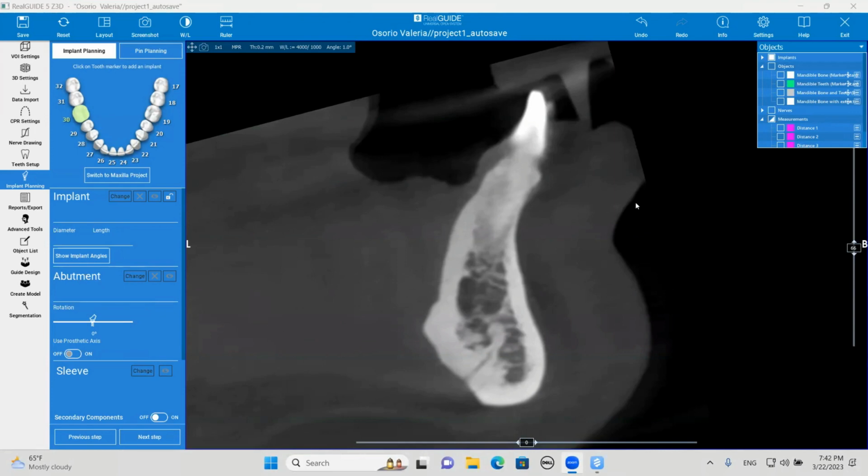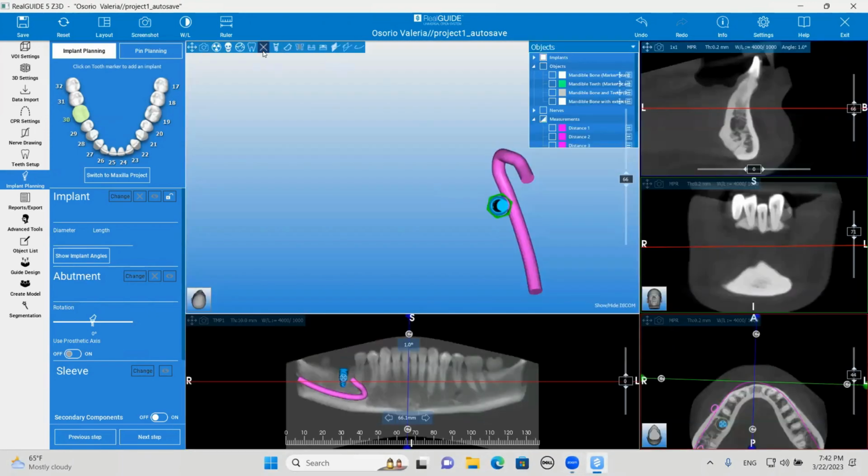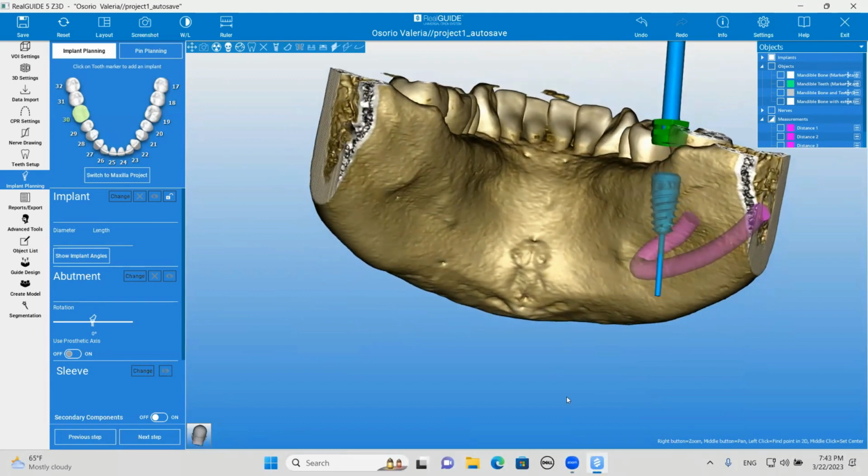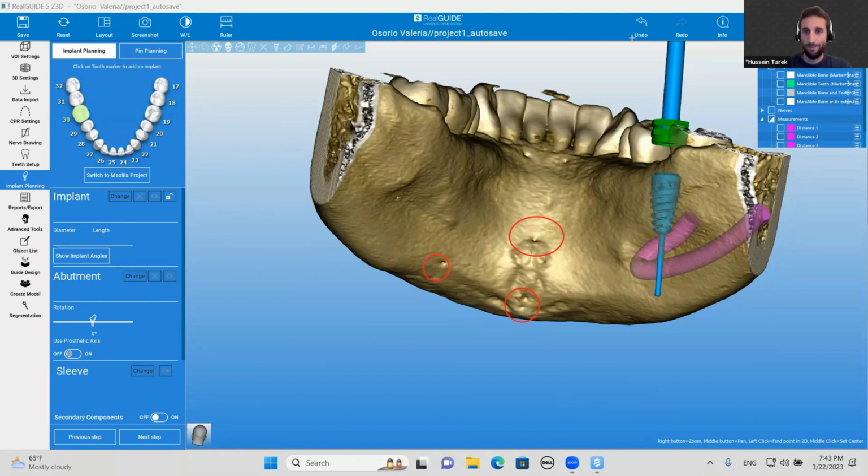Hussein, could you look on the 3D model and let's see if we can actually see this come through the lingual? Usually you don't see them like that. Oh yeah. Okay. Oh, here, perfect. So show them with the cursor the lingual foramen. Okay, see that little opening? That's called the lingual foramen. That's where the right and the left sublingual arteries come in. And here is where they exit out the lingual aspect. Okay, now there's another variant here. Oh, right there. Okay, so let's enlarge that so they can see that. Yes, sir.